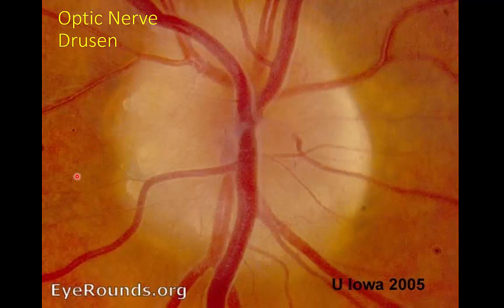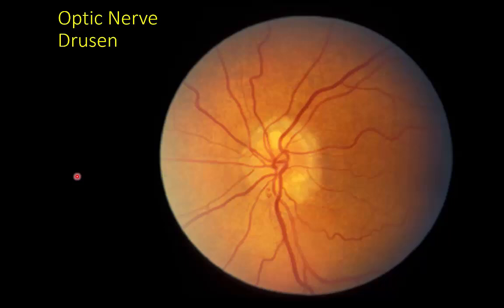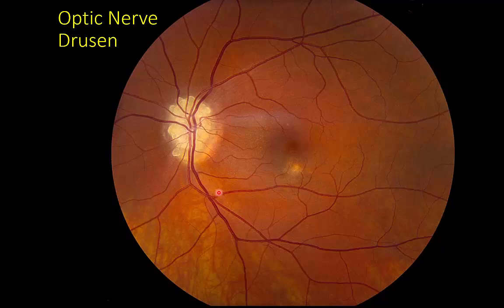Let's look at another example. Here's another example of optic nerve drusen. And again, you have this kind of lumpy shape around the optic disc. And finally, let's look at a really good example of this where you really can make out these calcified lumps around the disc. You do not want to mistake this as papilledema. Again, this is typically a benign finding. We defer to the ophthalmologist about can this cause any type of visual problem, which it rarely does. But this is optic nerve drusen.